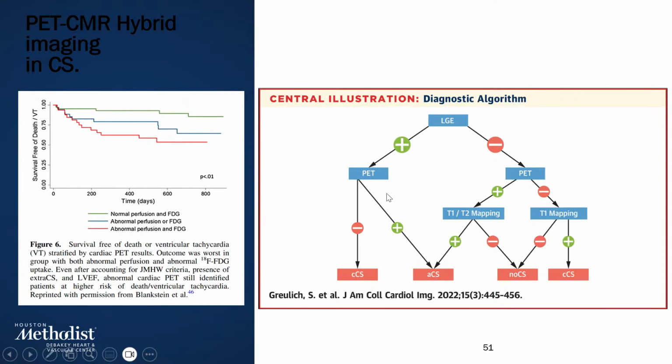But there are also patients who have chronic cardiac sarcoidosis where they have evidence of scar, or late gadolinium enhancement, to be more meticulous with the terminology, and negative PETs, which demonstrates that they do not have active inflammation. So we can see that our gentleman was on this side of the table and sort of straddles these two groups, because his anterior wall certainly showed evidence of active inflammation, but his inferior wall is probably a silent, indolent scar process.